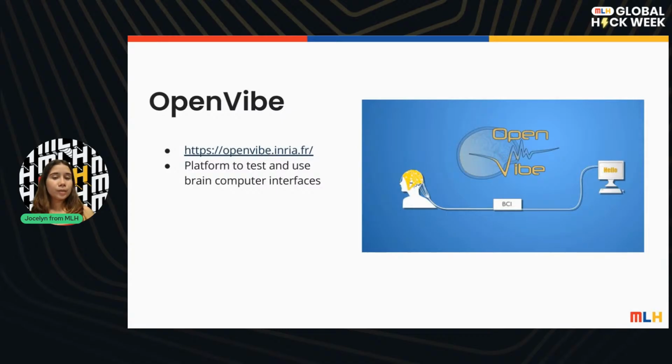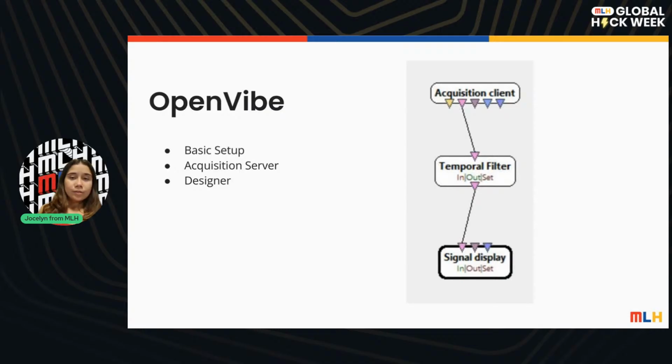We're not going to be doing many things today on OpenVibe, but I just wanted to have it on your computer so we can have a nice demo. So let's get started. Well, I start sharing my screen for doing this live demo.